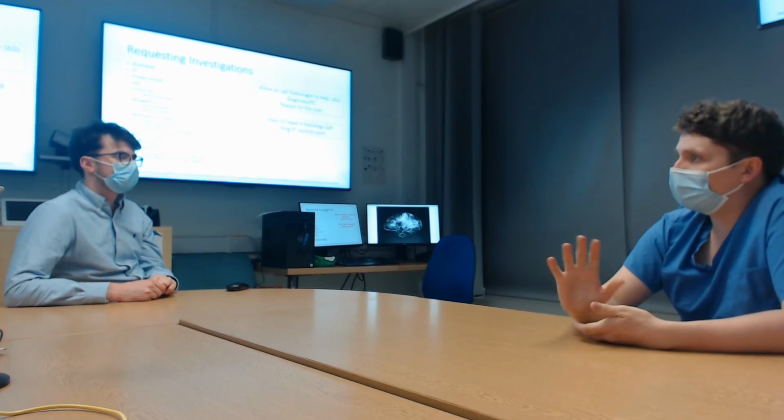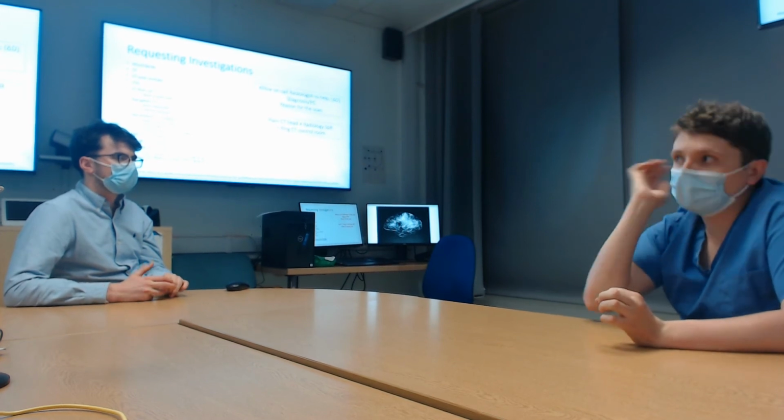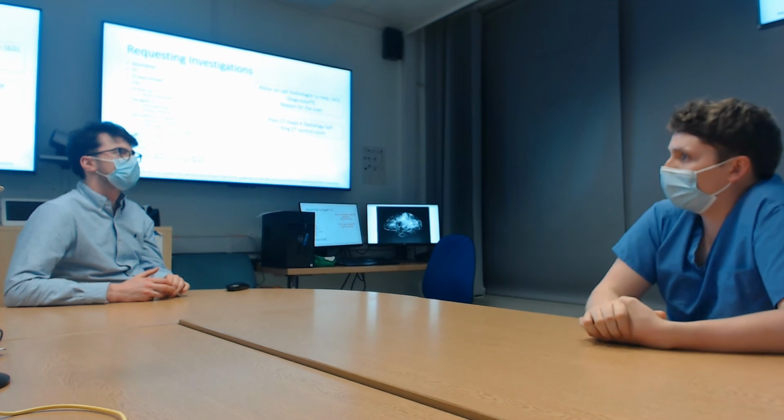Occasionally they'll do fiducial assisted, where they put up to 9, generally at least a bare minimum of 6, depending on the software, little markers that stick on that they scan with and stay with until they go down into theatre. They scan them with those markers on as well. They stick onto the skin, so you need to shave the head where you put them on and mark around them.